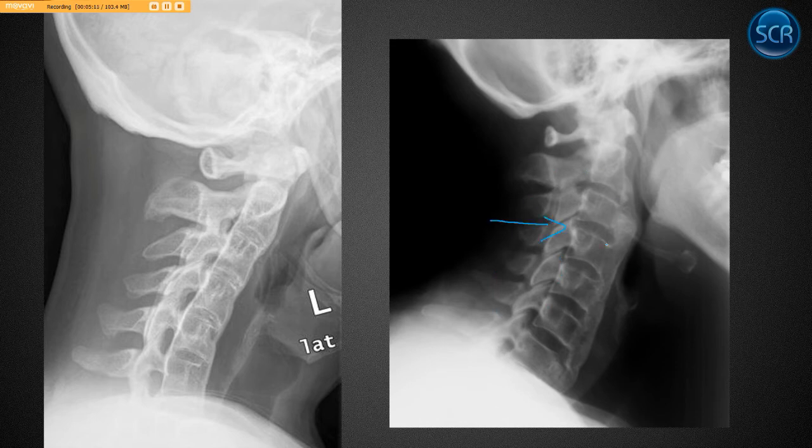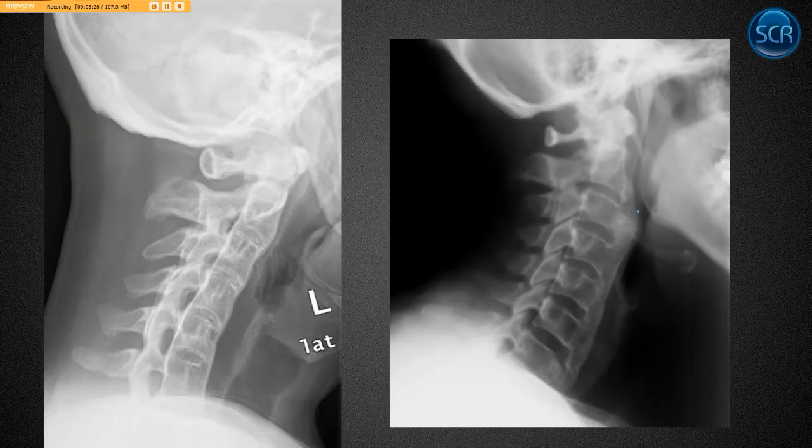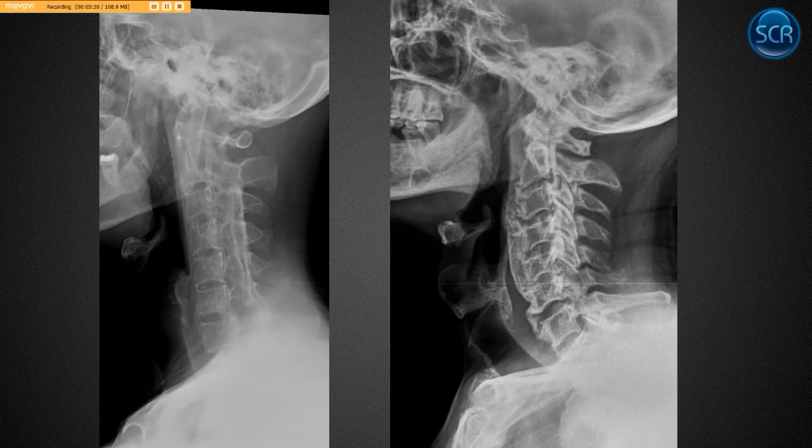If these were ankylosed back here, I could maybe say this is an atypical case of AS, but we're seeing this ALL calcification here, which is really quite thick, and everything open posteriorly. So this is just normal DISH. Of course, probably not going to get much movement here if you manipulate them because they're all fused up.